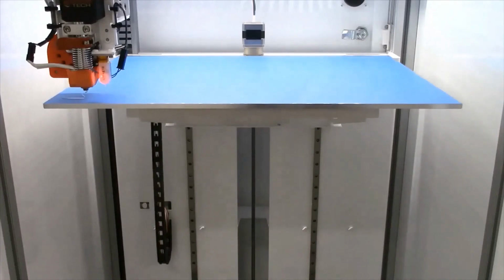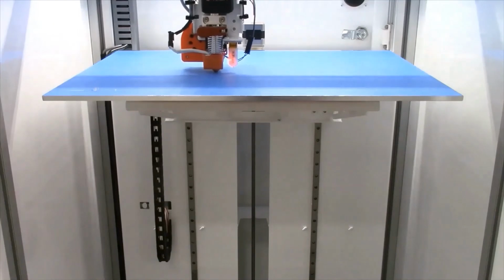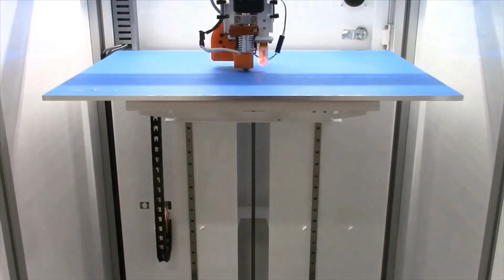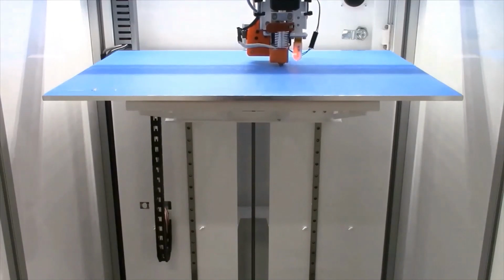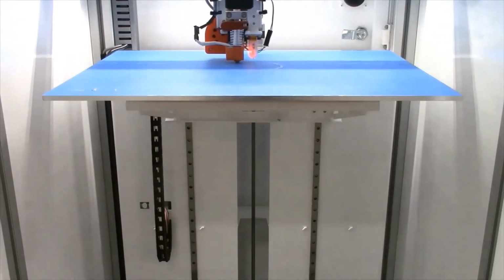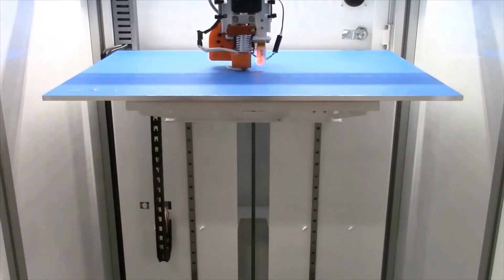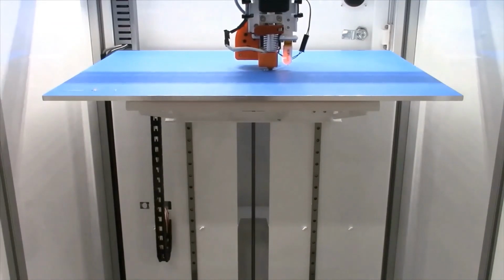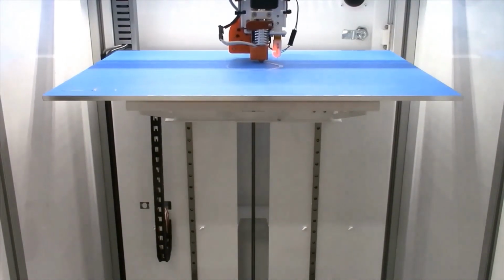After completing the 24-point probe, the printer will bring the extruder to the front of the print bed and prime the extruder by extruding a small amount of material before beginning the first layer of the print. From a fabrication standpoint, most of the print is automated, but it is important to monitor the first few layers of the print to ensure that the extruder is extruding material properly and that a good first layer of adhesion is applied.